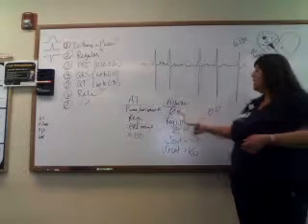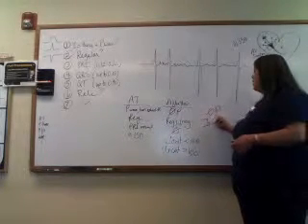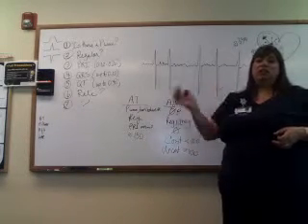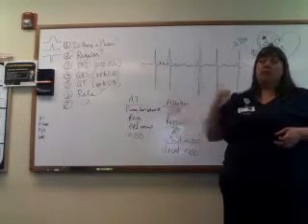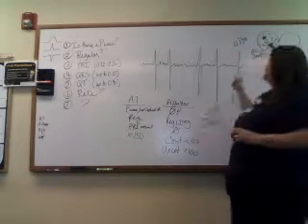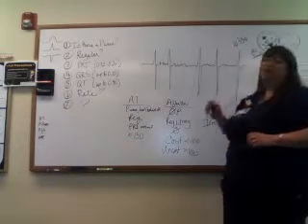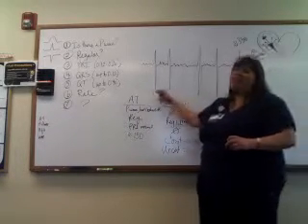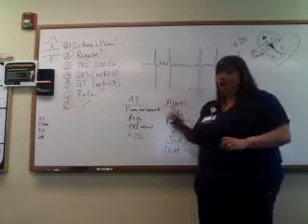This one has to be irregular, because the guy is just letting stimulation through so that the ventricle at least pumps. It's just picking points, okay? And because they're multiple points, they're firing at different time periods. So this one can never, ever, ever be regular.